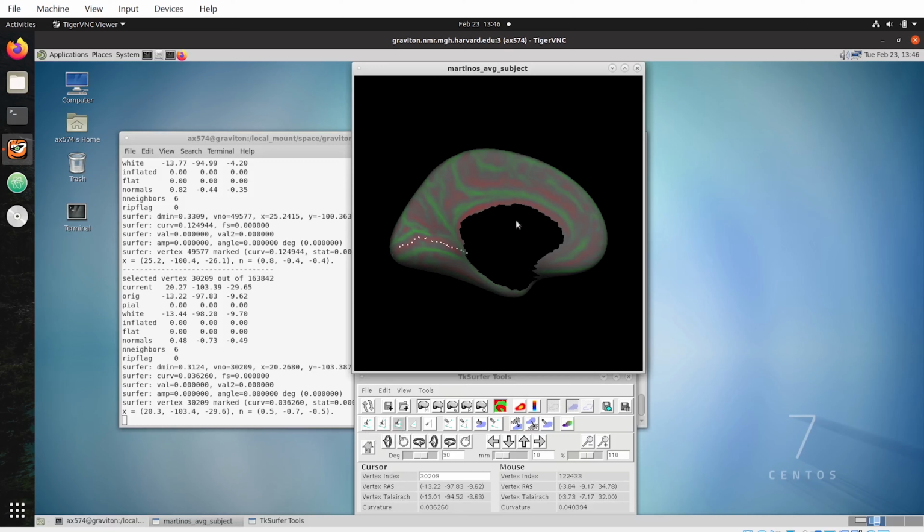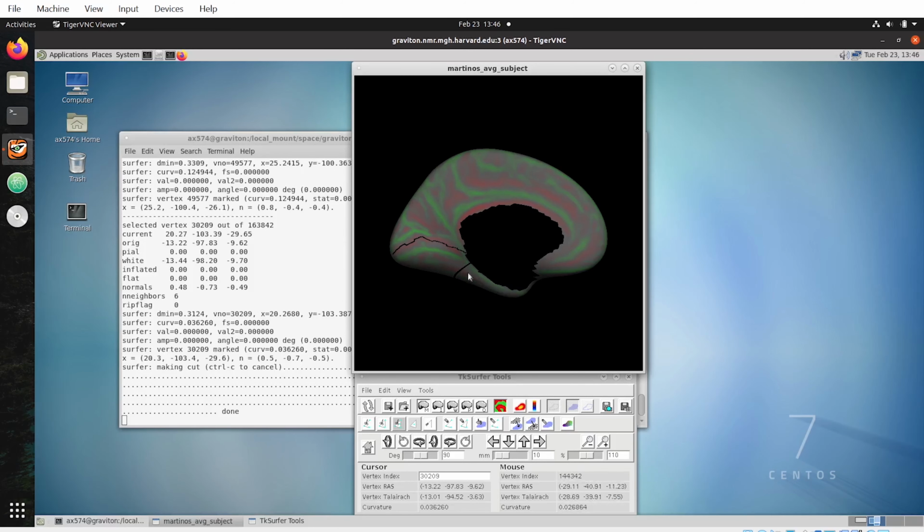For the medial wall we used a closed line. For the relaxation cuts, you want an open line. So that's just going to be the cut line icon. Okay, yeah, I don't know why it does that, but we don't really want that, so that's okay. I'll just do undo cut.